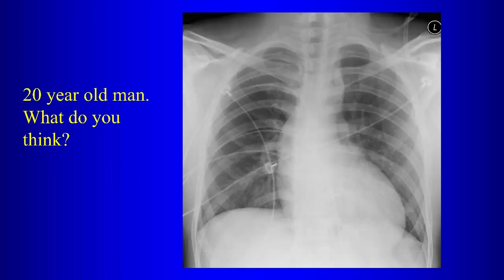The heart. Yeah, what about the heart? Left ventricular enlargement. Yeah, so why do you think there's left ventricular enlargement? Yeah, so the apex of the heart seems to be displaced downward, right? So that suggests that there's left ventricular enlargement here, okay? So that's certainly abnormal in a 20-year-old. What do you think of the ascending aorta? It's tortuous. See it? Yeah, it's tortuous, right?